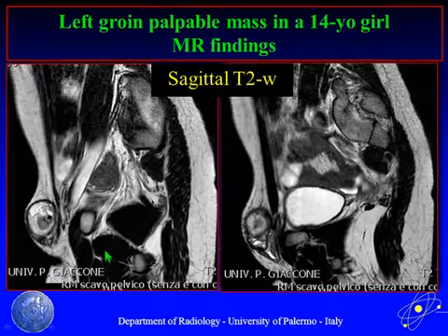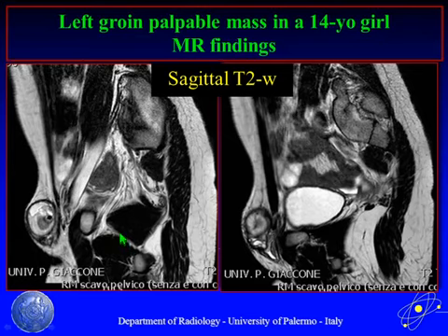And this is the MR of the same patient, which also demonstrates in this area a lesion with two different components. One component over there, another area over there with some multiple small cyst-like lesions.